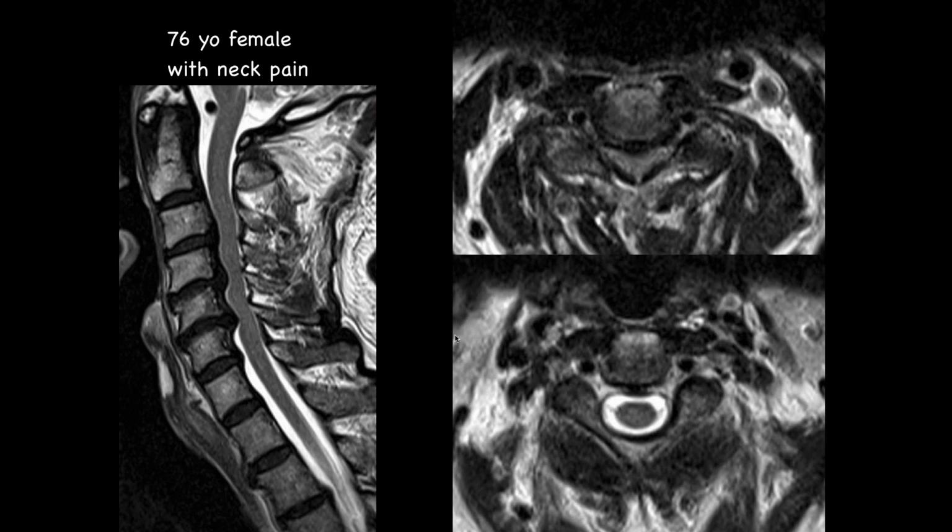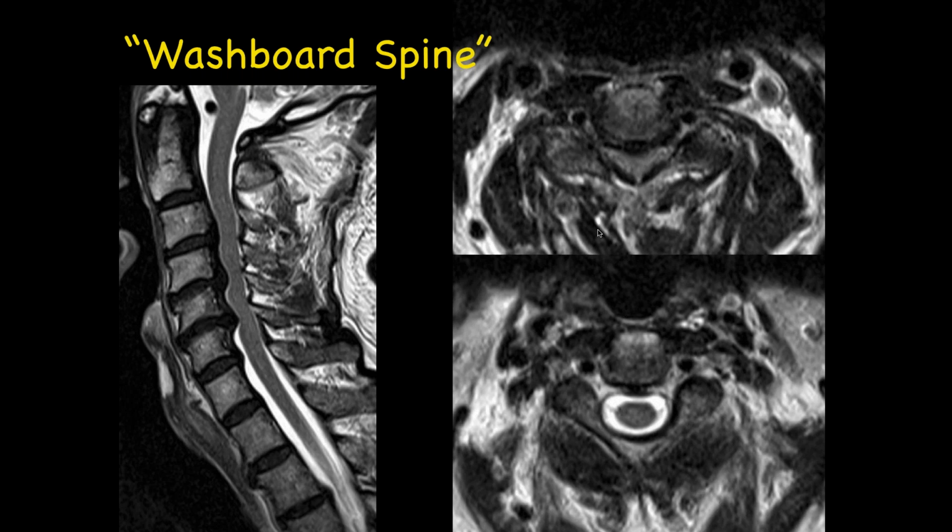Shiv, what do you think of this patient? Okay, 76-year-old female with neck pain. Similar to the last one, it looks like there's thickening of the posterior longitudinal ligament and multiple protrusions at several levels. And I don't see much signal in the disc this time, or the cord. Down below we can see it relatively normal, but at the level of the thickened posterior longitudinal ligament, we can see more compromise in central stenosis with a lack of CSF, though without cord signal change.